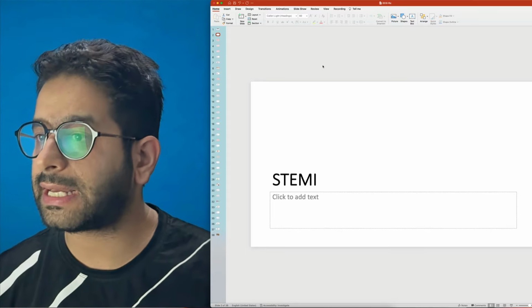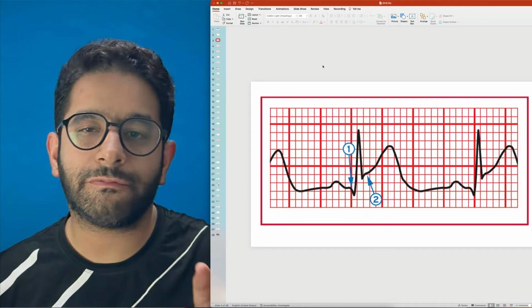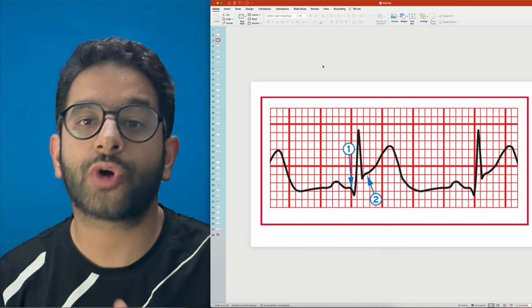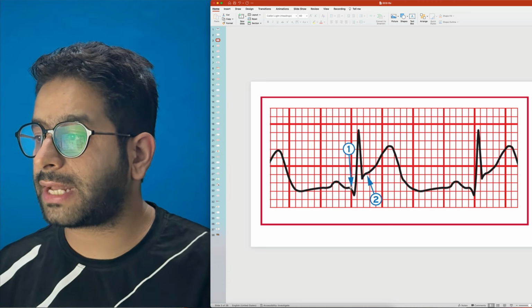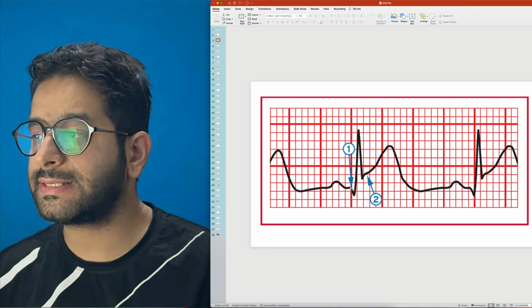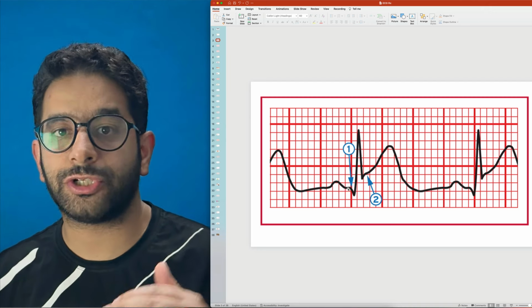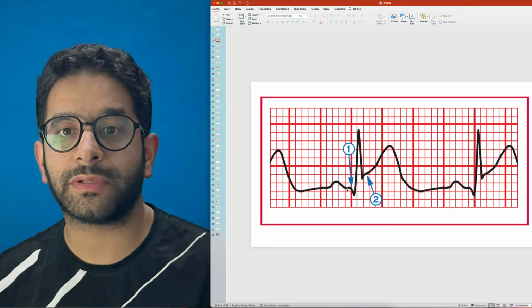The first ECG in the video was that of ST elevation MI. Now, if you're a beginner in the true sense, you may have a hard time seeing where the ST segment elevation is. What is ST segment elevation MI? So remember, this is the point that's the start of the QRS complex. It would be the onset of the Q wave. The segment prior to that would be the baseline of the ECG, right? So remember, your ST segment elevation or depression will be with respect to this particular line, this PQ segment, okay?